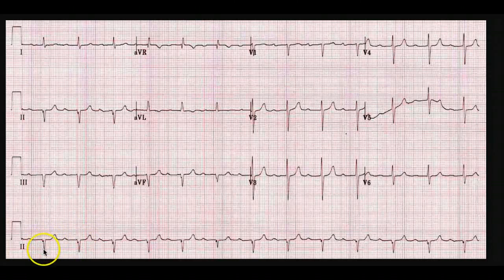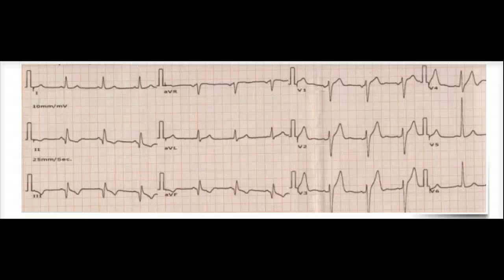So don't be alarmed if you see it in a patient who walks in for a regular checkup. They're just having a normal Q wave from an old infarct, because once you have a Q wave, it will never go away unless you perfuse them immediately. Okay, again, let's look at another ECG.